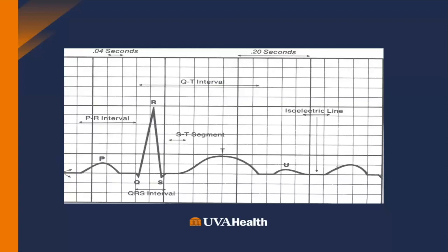And so what you would expect is a little bit of electricity, like the P wave, means that it doesn't travel very far and it's not traveling through a lot of muscle. Whereas the QRS complex here is a lot of electricity, because that's a larger part of the muscle and a further path that it follows to execute its contraction. So understanding intrinsically what an EKG is, it's a time map of electricity travel. And various things disrupt conduction and the time it takes for electricity to travel.